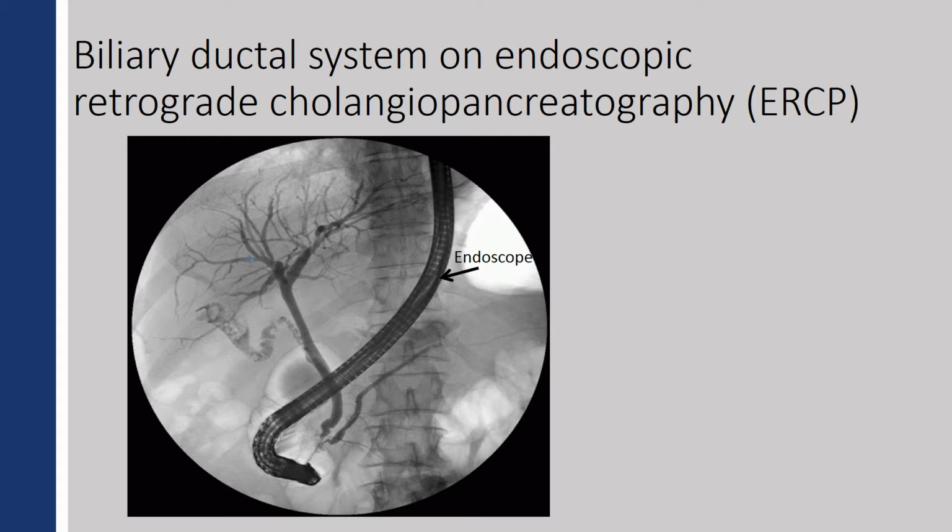And this is an endoscopic retrograde cholangiopancreatography. In typical medical fashion, we shorten that to ERCP. Although if you drop endoscopic retrograde cholangiopancreatography on your family at Thanksgiving dinner, they'll probably be very impressed and likely to think that, yes, you may truly be a doctor someday.